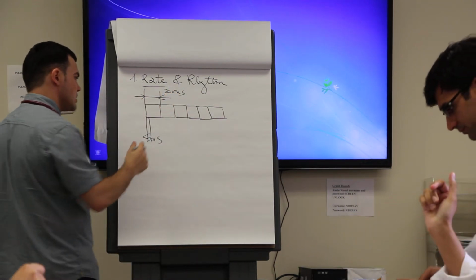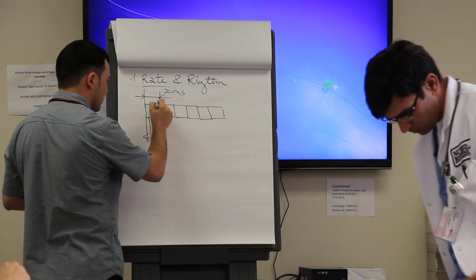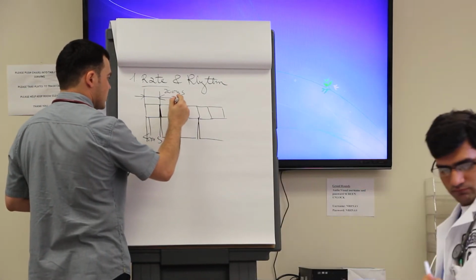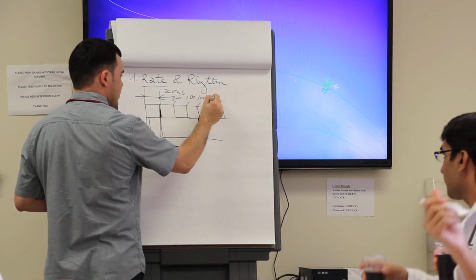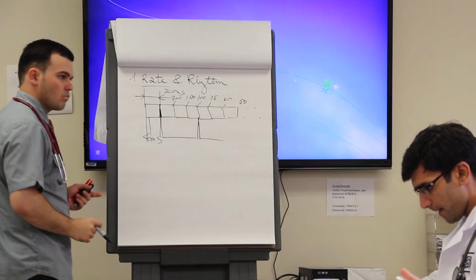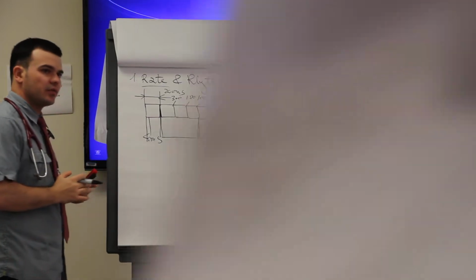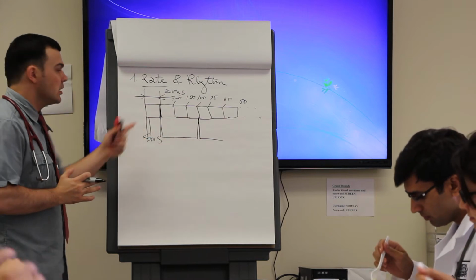All right, so the trick is to find a sharp wave or R wave, or whatever is very definite, to fall on one of those big lines, and see where the next will fall. And then the rule is this. The first line is 300 BPM, the second one is 150, then 100, 75, 60, 50, and so forth, okay? So this is one of the easiest ways to establish rate. If you have a regular rate, you can call it. So it shouldn't be such a difficult task to establish rate, especially if it's regular, right? You see the big lines, you know the big boxes, and you establish rate.